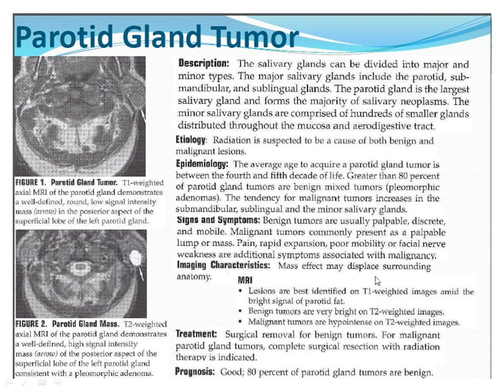Here's a parotid gland tumor. There's a few different kinds of tumors that can occur in the parotid gland. We usually don't identify exactly what they are before resecting them, so it's kind of similar to the ependymoma meningioma question. What you'll see is usually fairly well circumscribed lesions with enhancement. You may see one on the other side that may give you a clue as to what the etiology of it is. Sometimes you can have a lymph node within the gland that would have a kind of confusing appearance. So usually getting these in a few different planes will help you tell whether it's a lymph node or not.